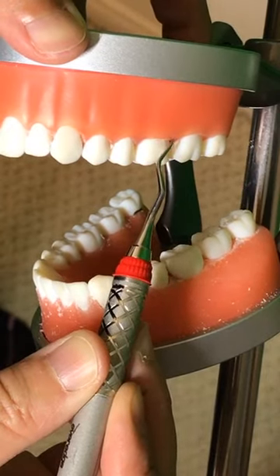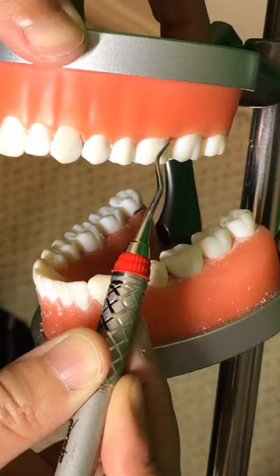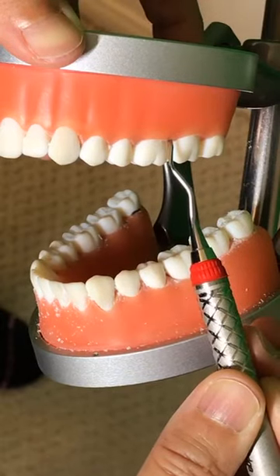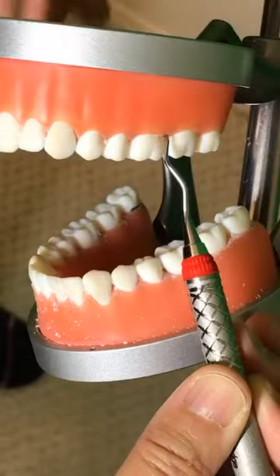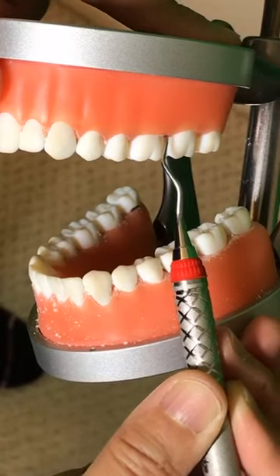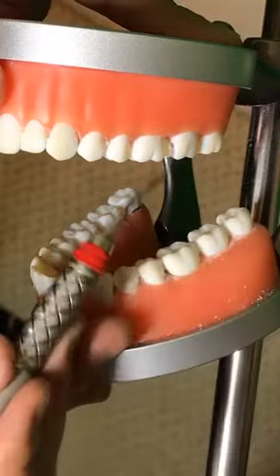This terminal shank is not parallel, so it is not going to be useful. You can make it parallel by going like this, but it's impossible because there is a slot and then there is the neck of the patient, so the handle would never be placed like this. So here is one way to identify the wrong end. This is the correct end.